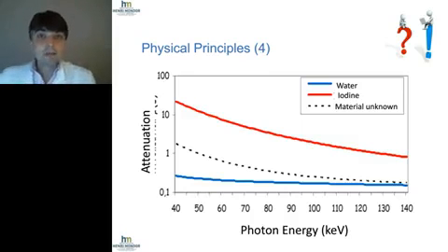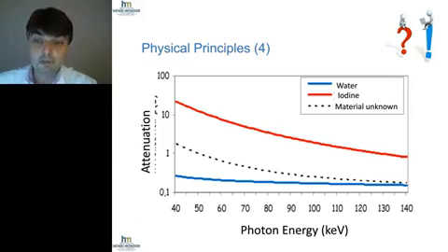So to sum that up in a single slide so that we make it simple and easy to understand. First advantage of using spectral imaging is that you can actually reconstruct different energy levels so that you could improve the attenuation profile of different materials. Look at the attenuation profile of the iodine. The attenuation is highest when you reduce the energies of the photons.